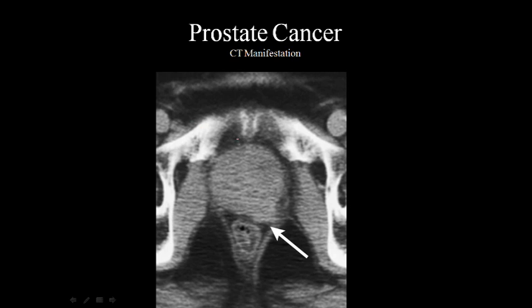This image allows you to see that maybe there's something going on. You have what looks to be an extension of a normal, smooth, rounded area, and you have some stuff going on here, which presumably is extension of the fat. That's typically what we're going to say this is, but other than that, it looks like one homogeneous structure, and we really can't see what is actually going on.